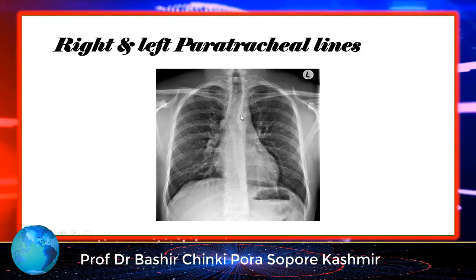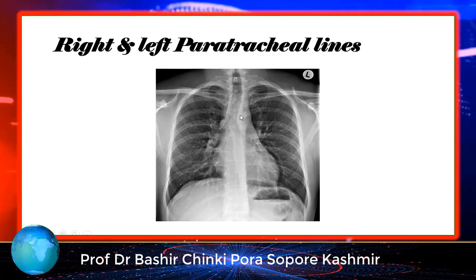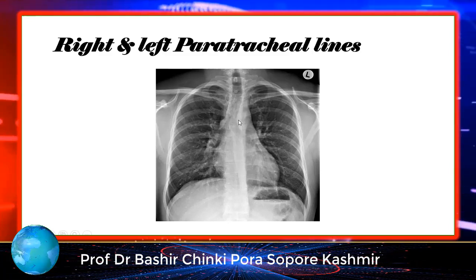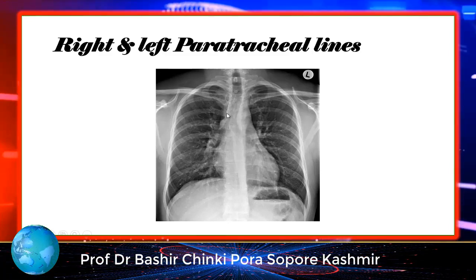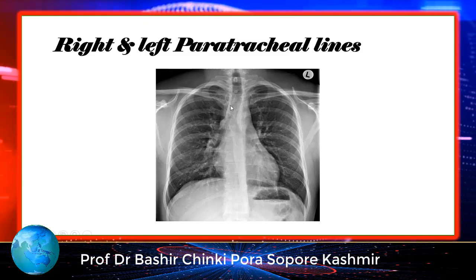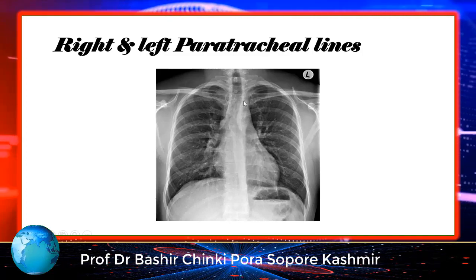On this side also you can see the vertical thin lines, and this will be the right para-tracheal line, and this will be the left para-tracheal line.